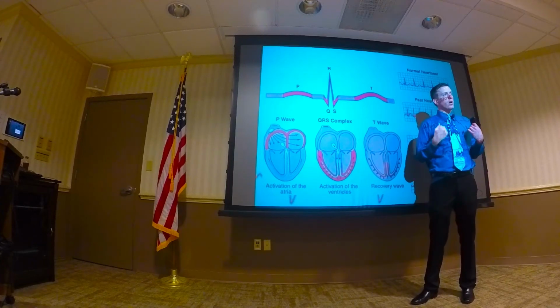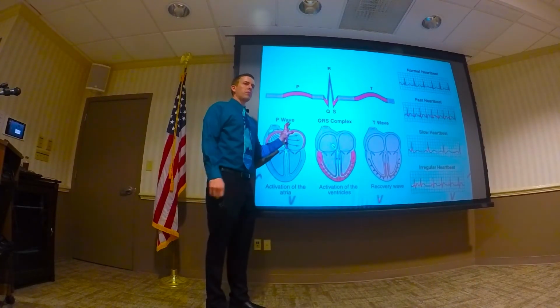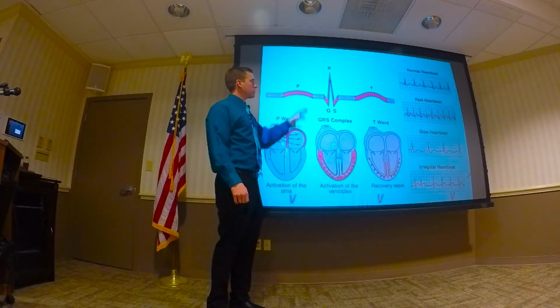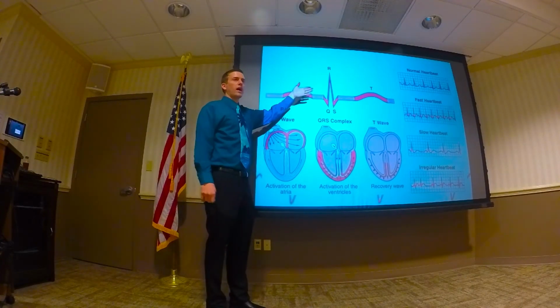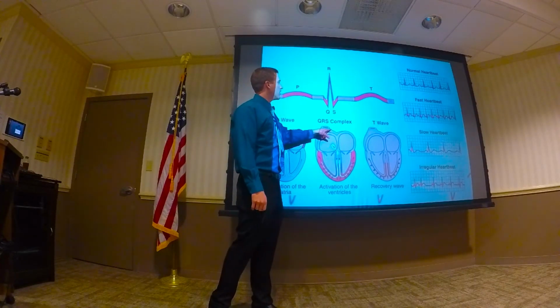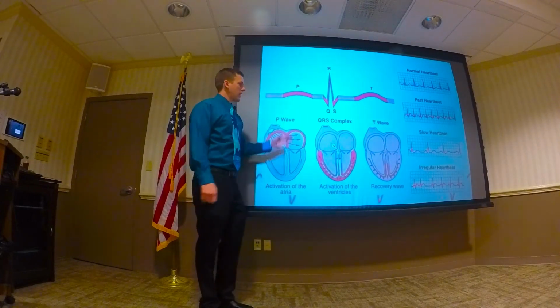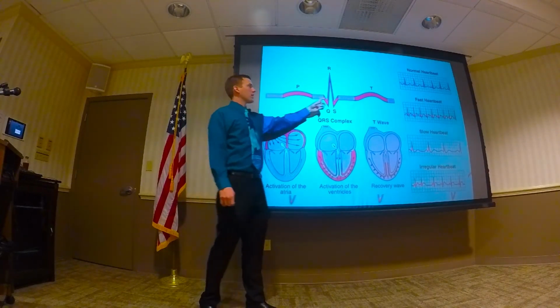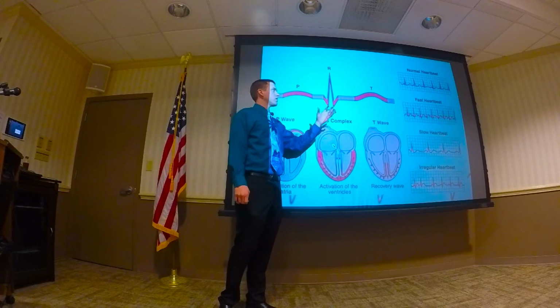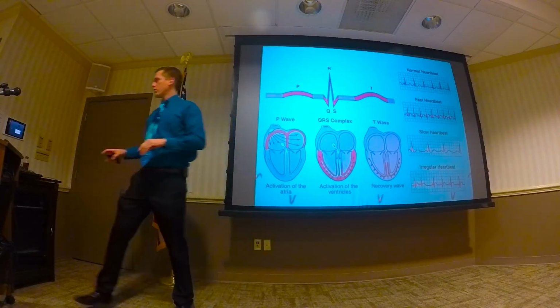If I were to flip those, and I would start to look from the right side, and lead 1 was backwards, like limb lead reversal, I would expect the exact opposite of that. The P wave would be upside down. You would have a little R, and then a Q, and then it would come back up, and then the T wave would be inverted, right? So that's the idea that where you put the sticker determines what kind of depolarization and what kind of axis you get. All right, we'll talk a little bit more about that without going too crazy.